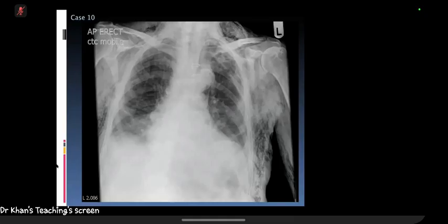Looking at the lungs and the mediastinum, I see a median sternotomy wire. The lungs appear well inflated, actually. I don't see an obvious pneumothorax bilaterally, but I'd be concerned that there must be some injury to the lungs causing this very florid surgical emphysema.